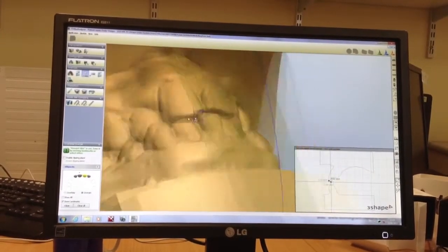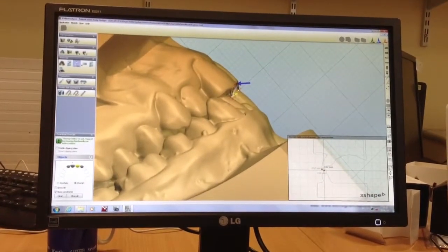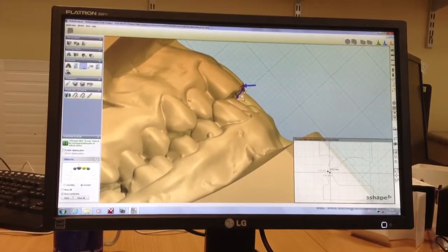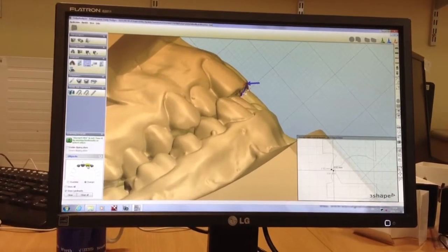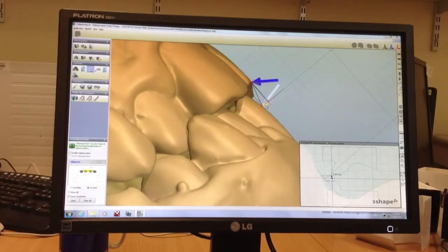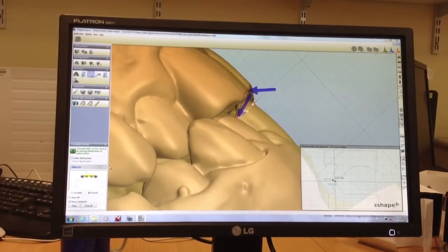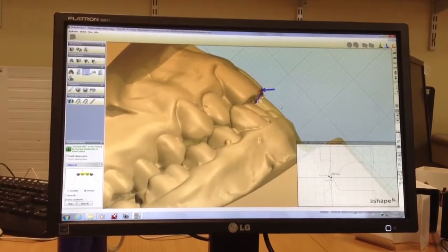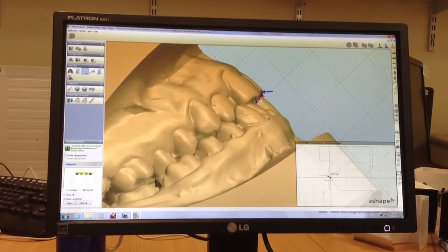a slightly larger value. Now the question is always around, if you were using a plastic ruler, would the plastic ruler get in that far in order to get us that measurement? The difference between the two measurements is 0.82 and 2.6. Thankfully, they fall within the same category anyway. They're both scoring a 0, but that could be the difference between a 0 and a 1, or a 1 and a 2. So we're happy with that.